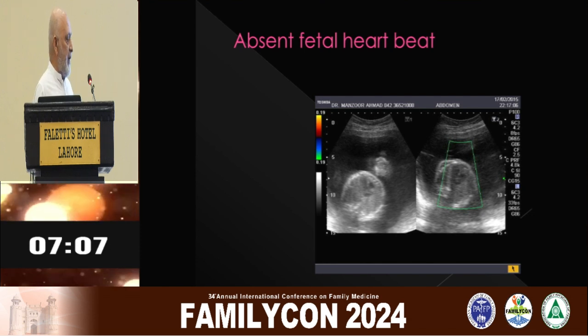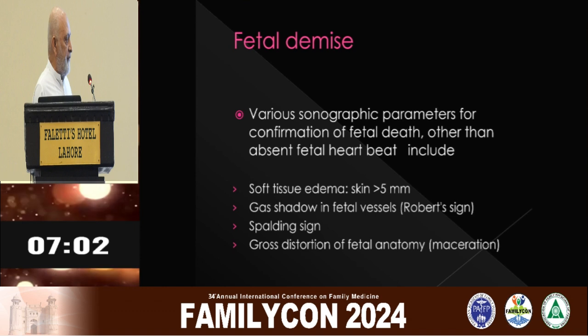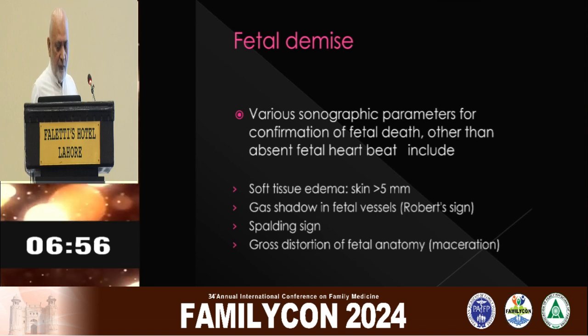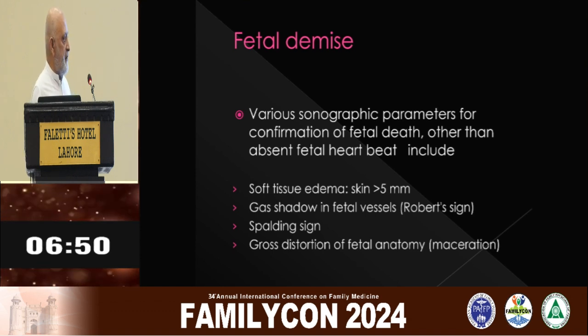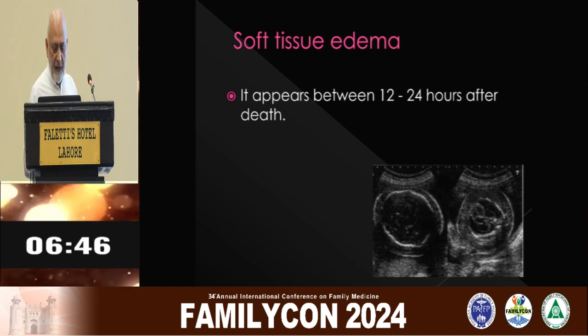And various other parameters to see the demise are soft tissue edema of the skin more than 5 millimeters, then gas shadowing within the fetal vessels, that is the Robert sign. There may be gross distortion of the fetal anatomy, and you can see here the fetal skin edema appears within 24 hours after intrauterine fetal death.